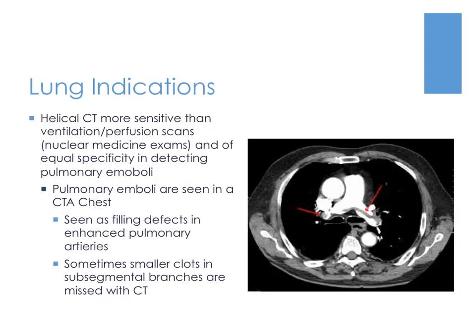So essentially, if there is a pulmonary embolism, also known as a PE, you'll see the contrast in the pulmonary trunk right here and through the right and left pulmonary branches be white, but if there's a pulmonary emboli, it will show up as a darker density where the contrast is not filling that part of the anatomy.